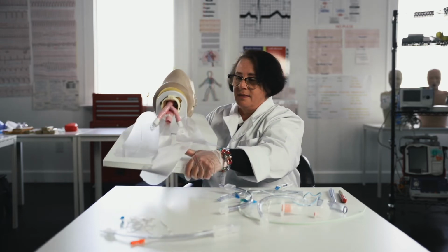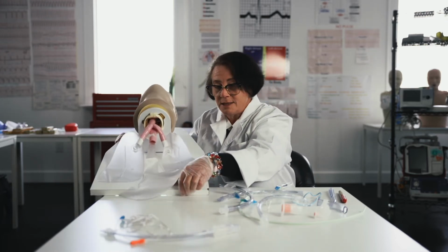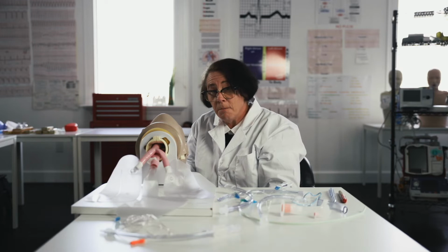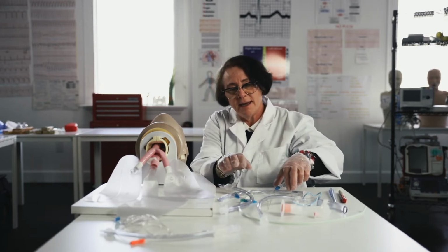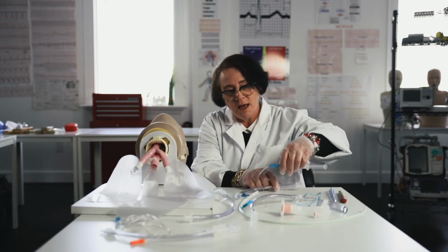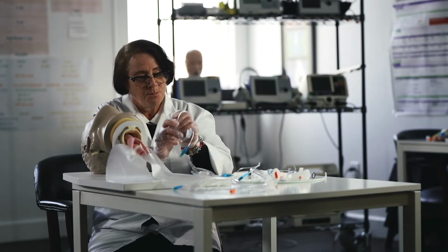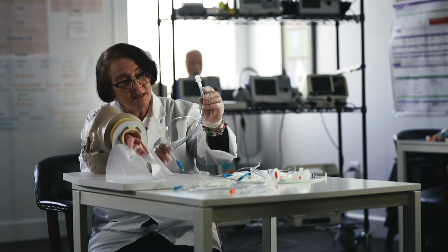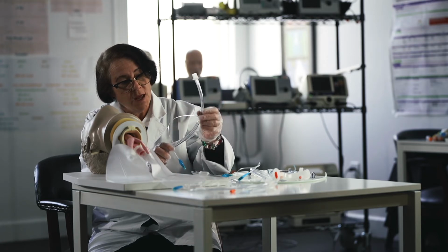So those are uncommon. I would say most of the time, once they get a breathing tube and our endotracheal tube and they're intubated, you're going to see 100% O2 sats, bilateral breath sounds, bilateral chest rise. Endotracheal tubes are very simple devices. Now, that's where you're going to hook it into your bag valve mask and vent tubing. That's the size. Here's a ruler.